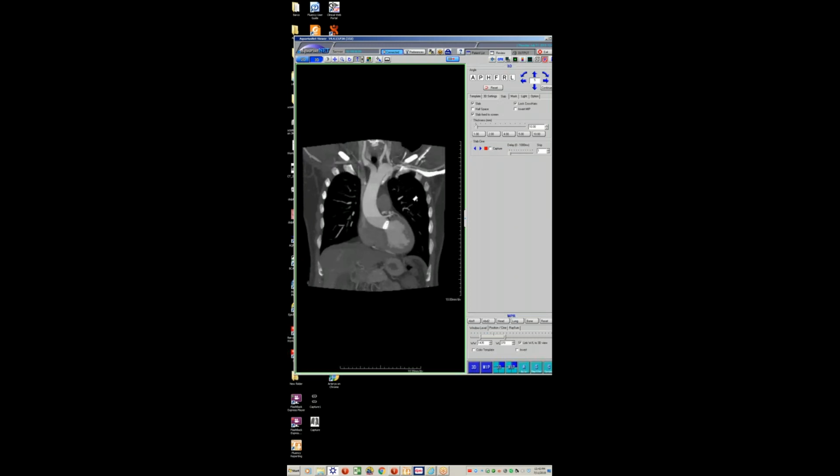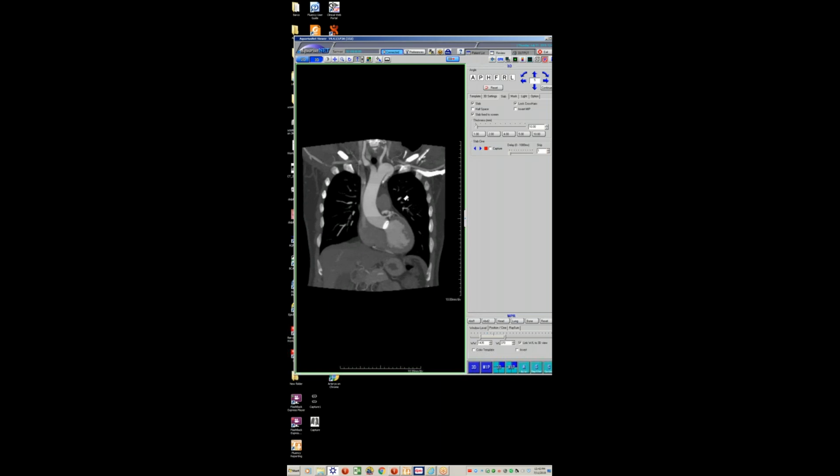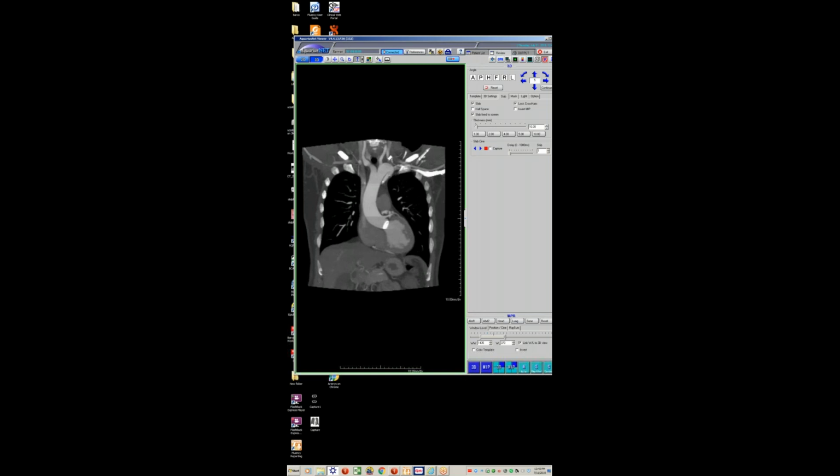What are your thoughts? Typically cervical arches have funny branch patterns of the carotids and other things, because it's a different persistent embryologic arch that contributes to it. So that's something that can be helpful. That one, I don't know. The pseudocoarcs are often very high riding arches.